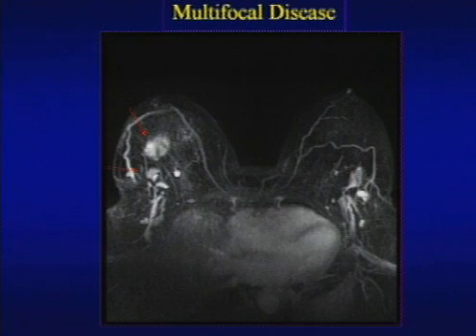So this is an example. Patient, known cancer, irregular mass, and in this patient, another small satellite lesion that was seen. However, as these were the only 2 lesions, an attempt could be made at breast conservation.